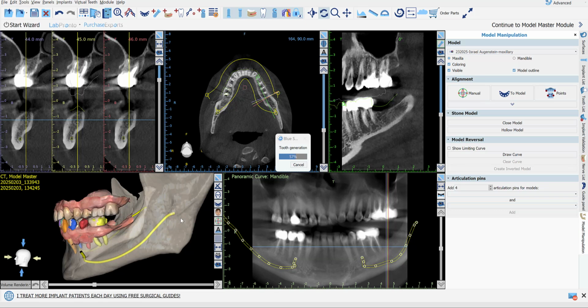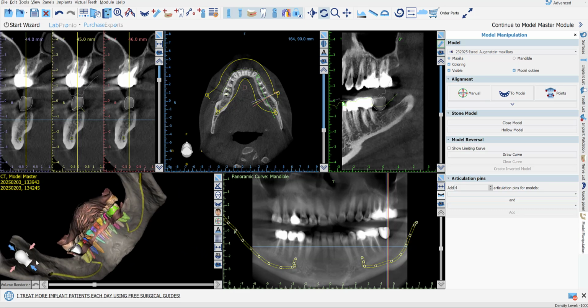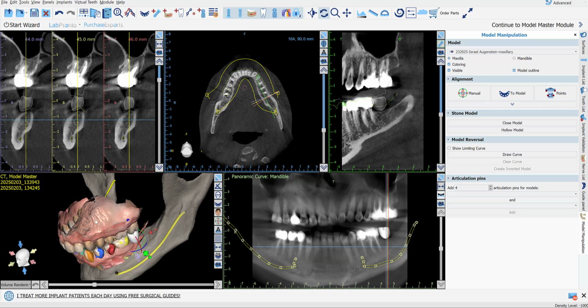That'll allow us to know where our final restoration is going to go, and then putting the implant underneath that becomes a far easier endeavor. What I find sometimes is we'll put in the implant where more or less the bone wants to go, but it's not going to be a great restorative plan. So we've got our tooth here.